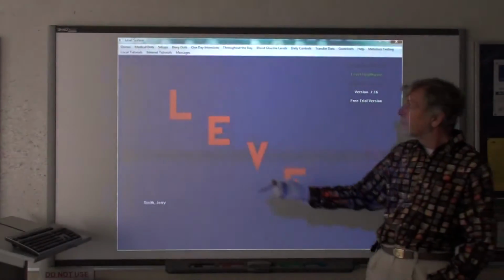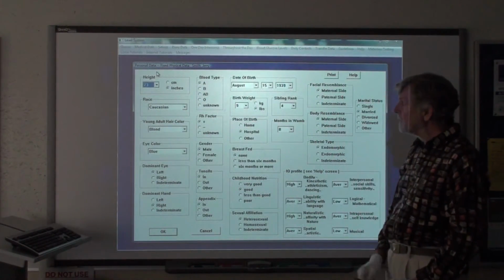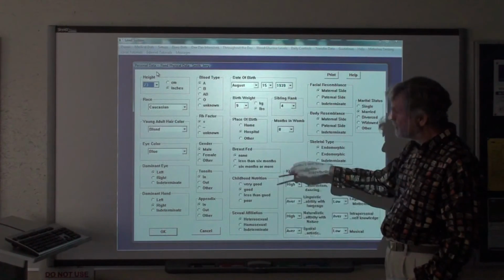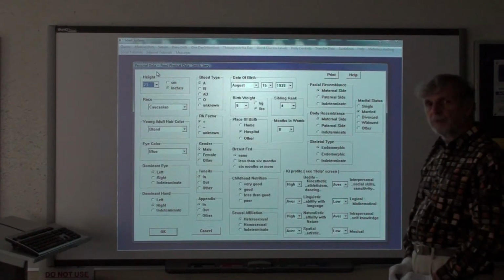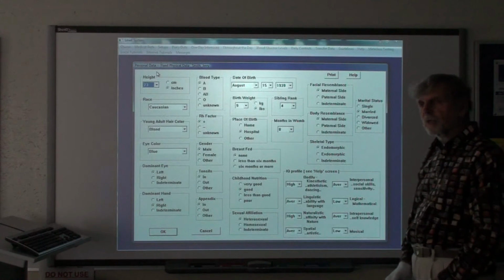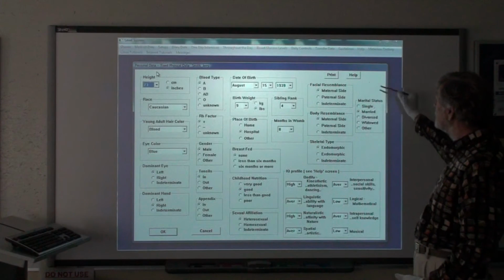Another form that has similar usefulness is their fixed physical data, in which their height, weight, hair color, eye color, date of birth, birth weight, and other aspects of their early childhood, and physical characteristics that might or might not be pertinent to diabetes are recorded by the patient, and as soon as they record them and check back in on internet data storage, then they also become visible to you.